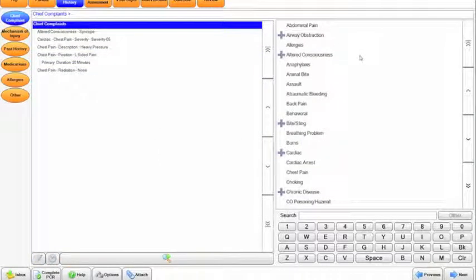One feature of this particular setup is the ability to search down here. And you'll find this throughout a bunch of different menus throughout the program. It may not be as useful here, but it is an option. The one caveat to this particular feature is that it only allows you to search this first menu. So if I type in something that falls underneath a subcategory, it will not locate it. So for this particular instance, it might not be as useful, but the option is there.